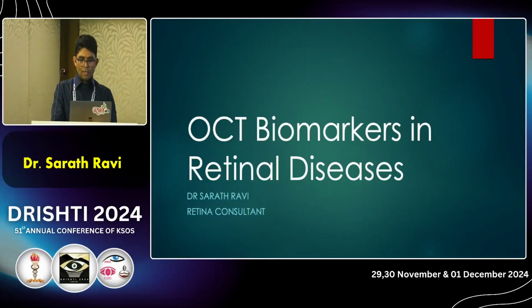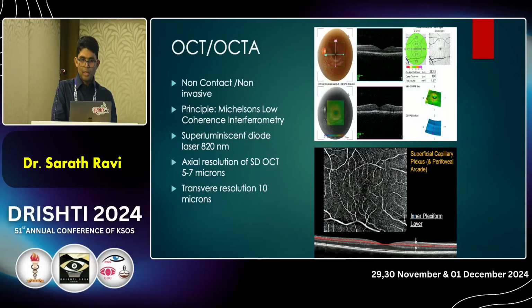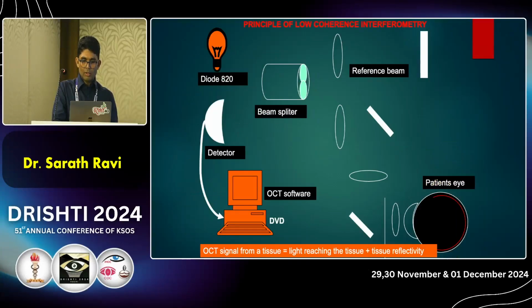Thank you. My talk is on OCT biomarkers in retinal diseases. We look at the retinal OCT helping to identify specific retinal biomarkers that are important in visual acuity at baseline as well as indicate the prognosis to treatment. It's a non-invasive, non-contact imaging modality based on the Michelson's principle of low coherence interferometry and has got an axial resolution of 5 to 7 microns and a transverse resolution of 10 microns.